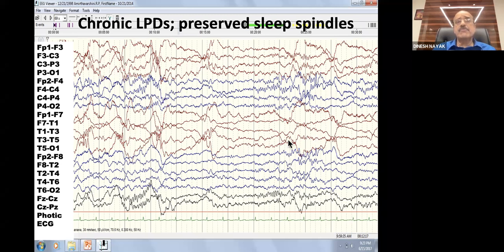So this is a good example of chronic lateralized periodic discharges because of some very old, remote insult, but it can sometimes result in PLEDs happening all the time.